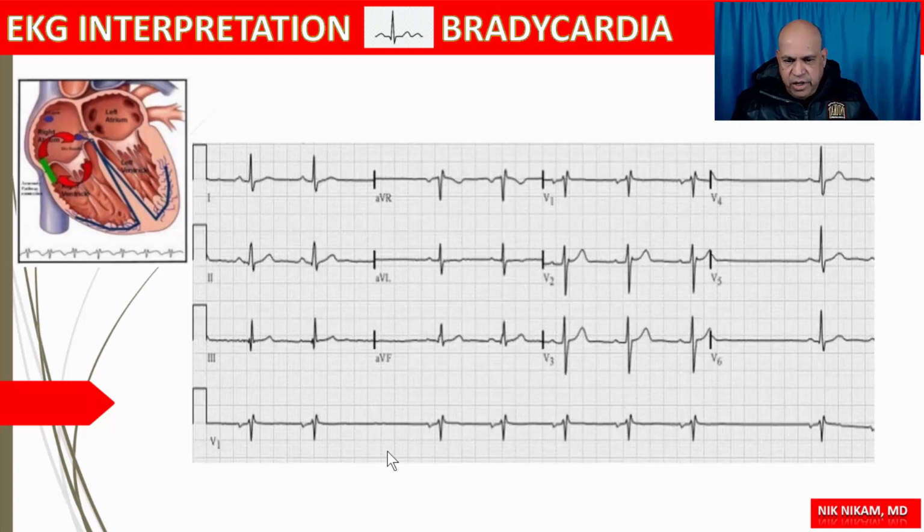Alright, what do we see here? It looks similar to the previous electrocardiogram we saw. We have a sinus beat and a sinus beat, and there is no atrial or ventricular activity. Then we have resumption of the sinus beats followed by another similar pause. So whenever we see these kind of grouped beats, we need to think about Wenckebach block or second degree heart block. However, if we don't see any atrial activity whatsoever, then you should think about sinus exit block.